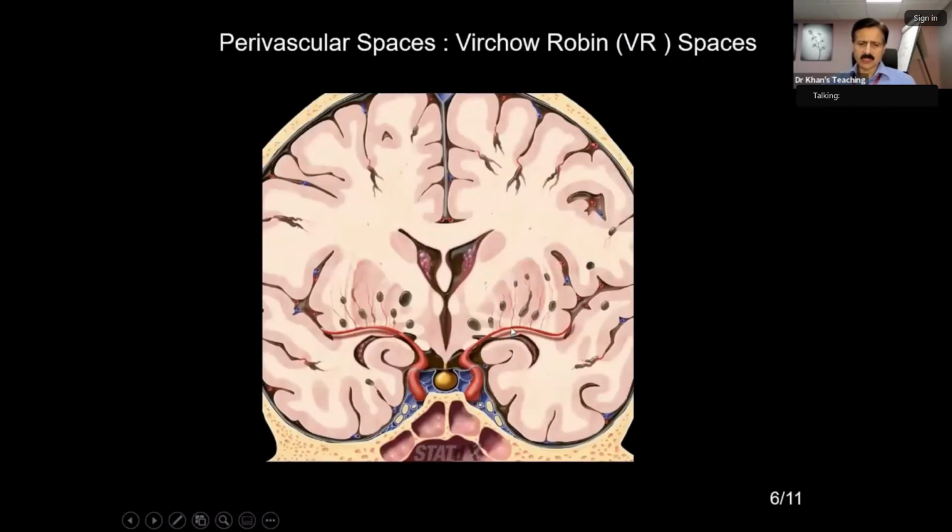Look at this picture here. Virchow-Robin spaces at times can be dilated or prominent as a normal variant. The key thing is that they are just like CSF on all sequences. They do not enhance. Anatomy is the key. Three types of Virchow-Robin spaces have been described in literature, but it can be more than that. So this is type 1, lenticulostriate arteries. In the basal ganglia region, many a time they will be dilated, and don't confuse it with a lacunar infarct. Similarly, they can be along the convexity, the medullary arteries, which go into the sulci.